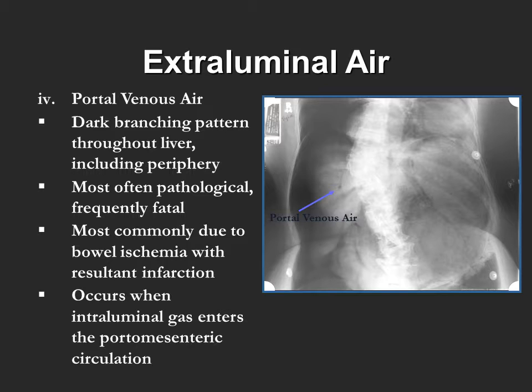the portal vein. The etiology of this finding can be due to ischemic causes and non-ischemic causes including sepsis, colon cancer, inflammatory bowel disease, trauma, and iatrogenic causes. Ischemic causes are the most common and have a worse prognosis. Portal venous air is most often pathological and frequently fatal.